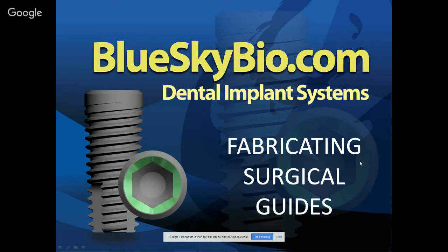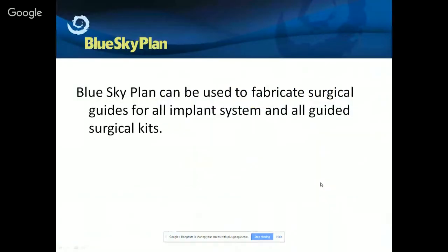Today's presentation, we're going to be discussing fabricating surgical guides with the Blue Sky Plan software. Blue Sky Plan, for those of you who may not be aware, is treatment planning software. It could be downloaded from the Blue Sky Bio website, and it could be used to fabricate surgical guides for all implant systems and all guided surgical kits. The software is free to use for treatment planning. You could design the surgical guide directly into the software.